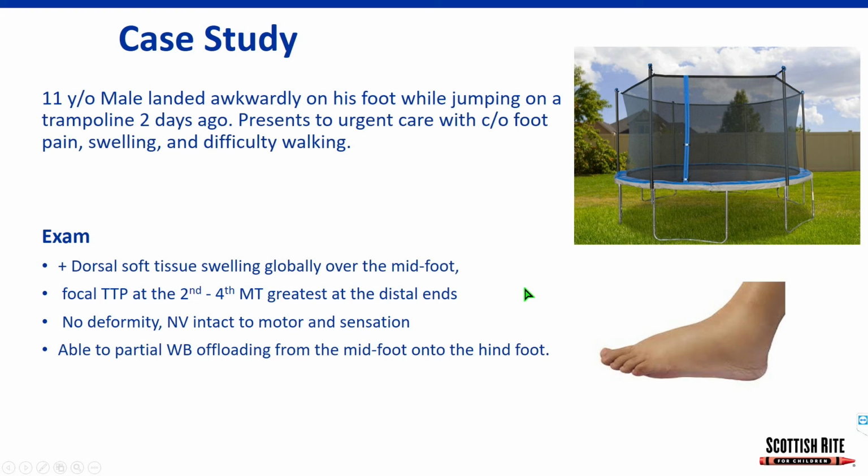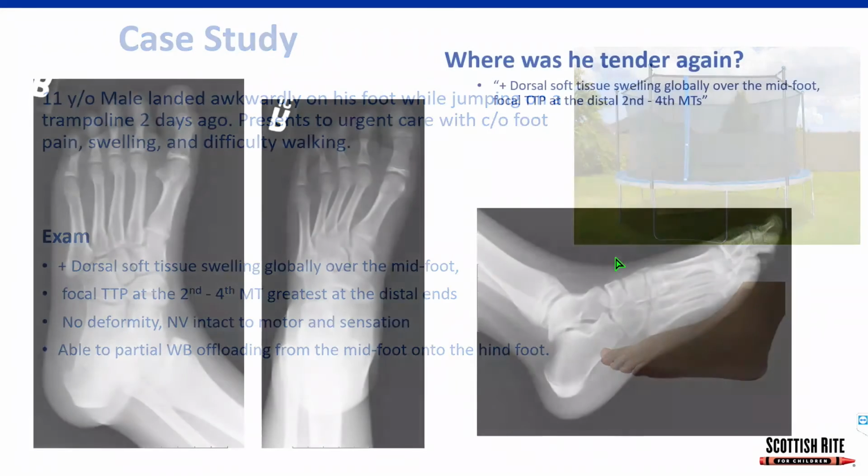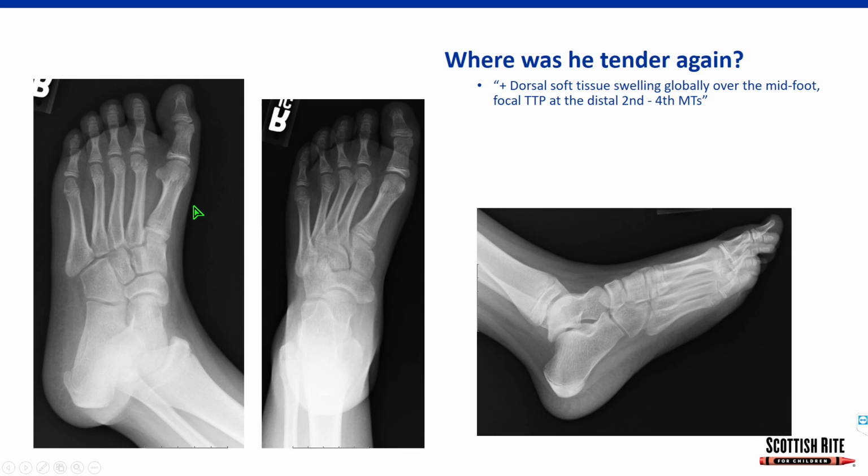Again, being able to rely on and trust your clinical exam is important, but it's not always easy because it's hard sometimes to trust the 11-year-old's clinical exam, and you may get a situation where everything you touch is tender or sore. Not always, but a lot of times that's the case. So correlate where they're most sensitive with your x-ray findings. So we go ahead and get our 3 views for this particular kid.